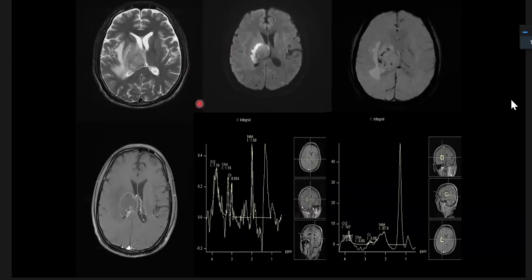So basically, in this case only lipid lactate was raised, while the rest of the metabolites were normal, and the lesion was T2 hypointense showing peripheral hemorrhages, no restricted diffusion, and peripheral thin enhancement. We have ruled out neoplasm and metastasis on the basis of spectroscopy and additional findings. So it was toxoplasmosis. Lymphoma is also ruled out because hemorrhages are present, a very blackish lesion without restricted diffusion, and normal choline peaks.